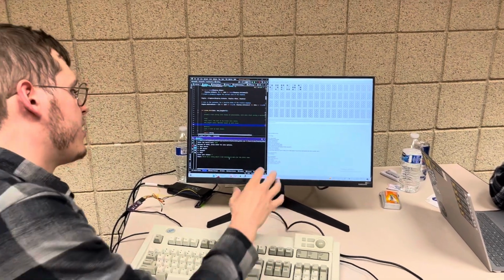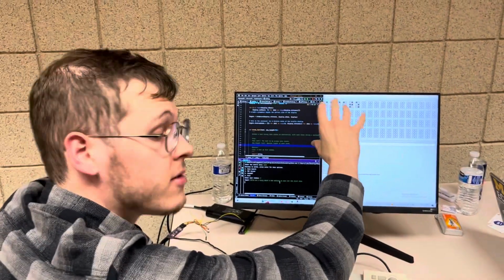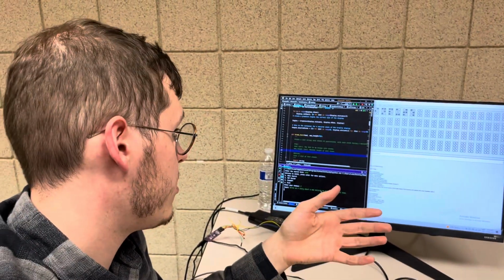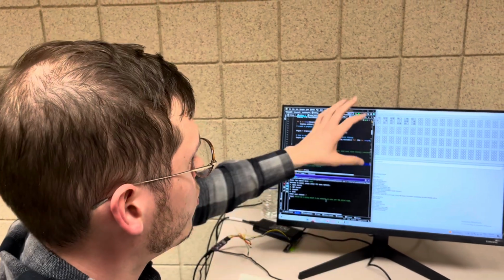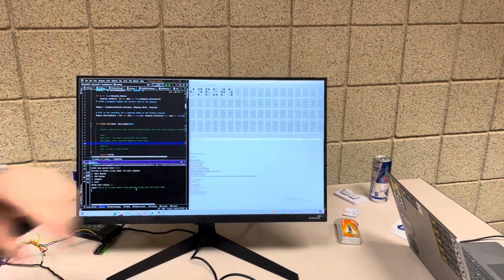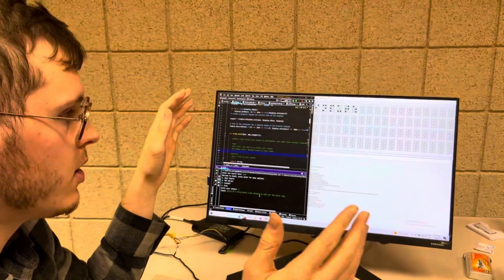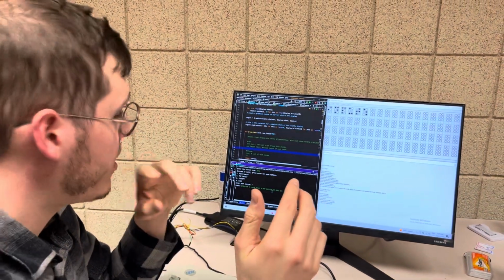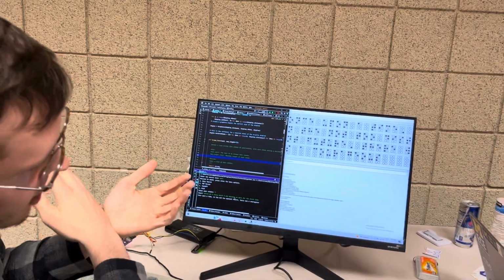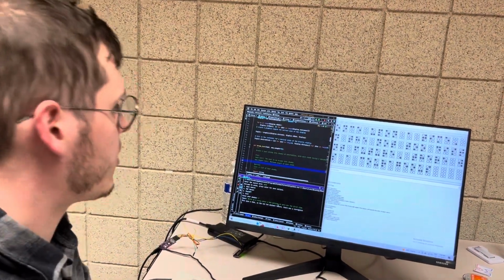Actually, I'm going to start explaining what's going to happen next. We built an algorithm that takes in a large string of text and chunks it based on punctuation, if possible, into sections that will fit on this HAP main window. It's 72 characters long for the Braille display, so it tries to chunk it into as close to 72 character segments as possible. Then we have a page reader, where it sets up all of these 72 character segments into multiple pages, lines them back to back, and you can navigate them using the arrow keys on your keyboard.